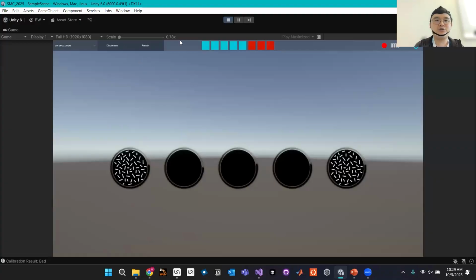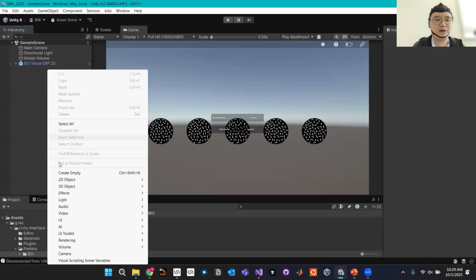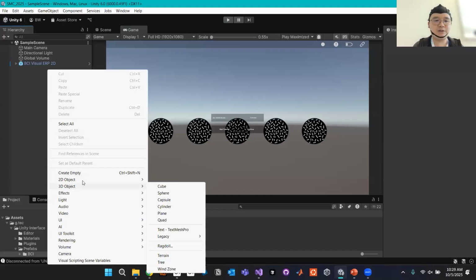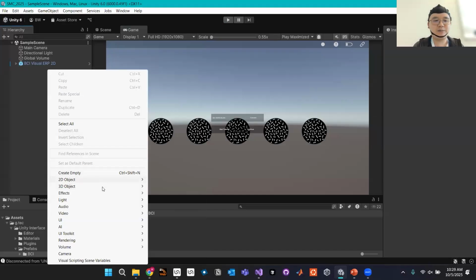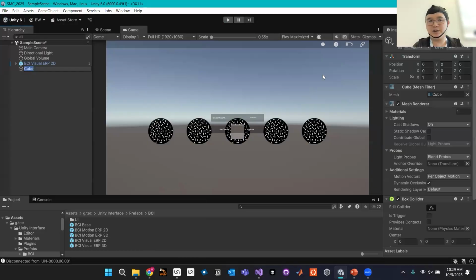Then I can also show you how you can create your own custom logic in it. So for example, we want ideally to do something when we have a simulation. For example, we have a cube, and I can change the position, say to 3. So this is up on top of the object 3, right?